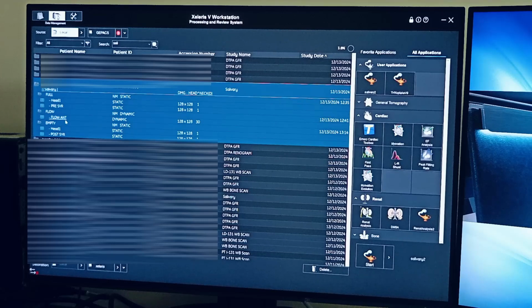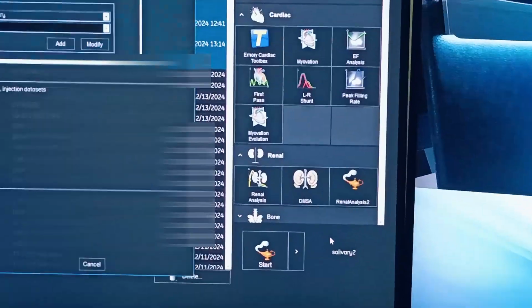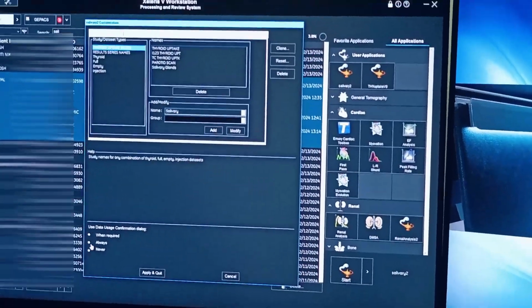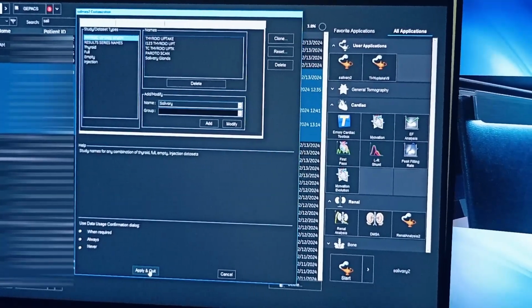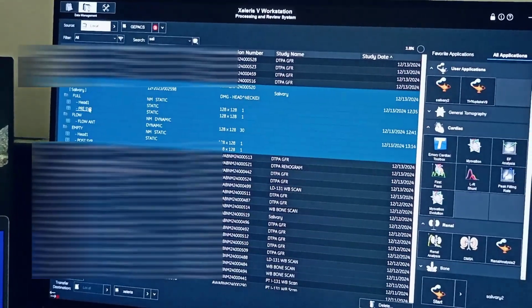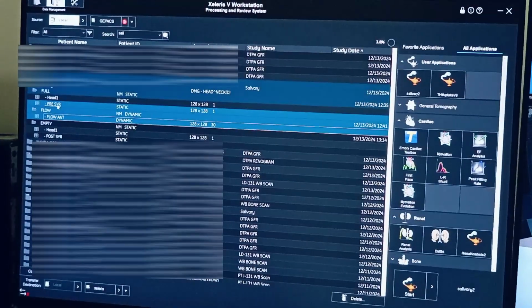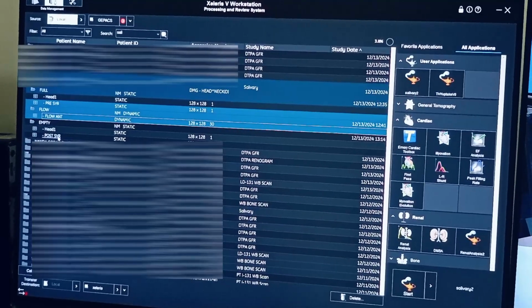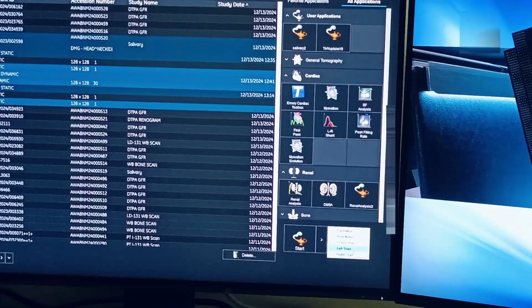So how to make it recognize? First you have to select that specific application, click on this small arrow and go to customize. Here there is nothing to do, just select this middle option, always, and then click apply. Then select the proper data set, like in this pre-syringe, flow anterior, and then post syringe. Then start processing.